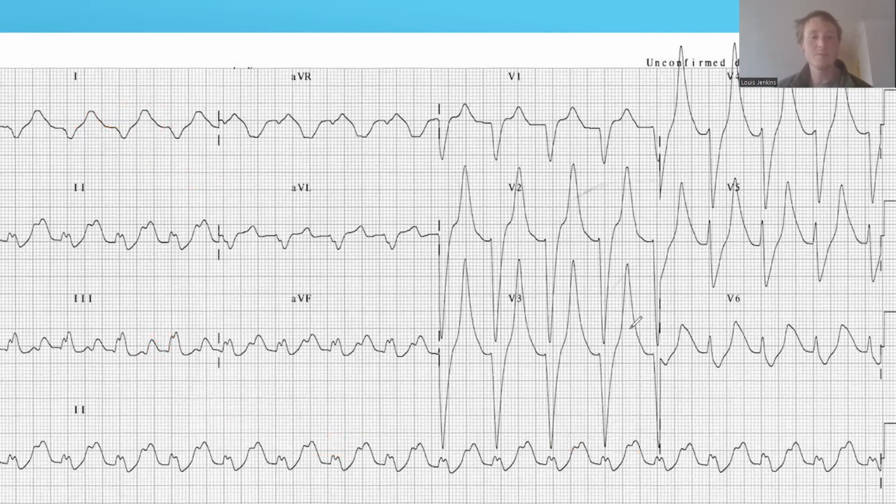But anyway, the point with this ECG is it's looking bizarre. We do have some massive hyperacute T waves. We've got some really massive QRS complexes as well. It's very hard to see where the P waves are. I think they fall in there somewhere because I can see a bunch of notching, and notching generally indicates that there's a P wave superimposed on something, but I can't tell if it's on this or on this.